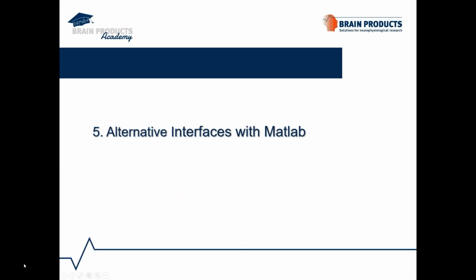So far, we have seen how to make use of the Matlab transformation in expanding Analyzer capabilities, by transferring the data to Matlab, performing some operations on it, and then returning to Analyzer. But now I want to briefly talk about the interaction between Analyzer and Matlab in general, mainly on exporting and importing data.